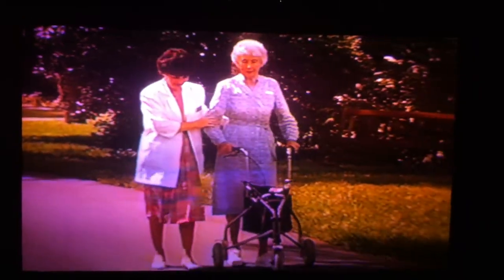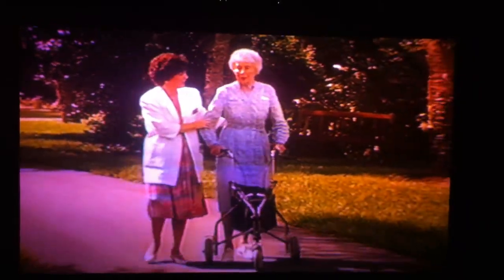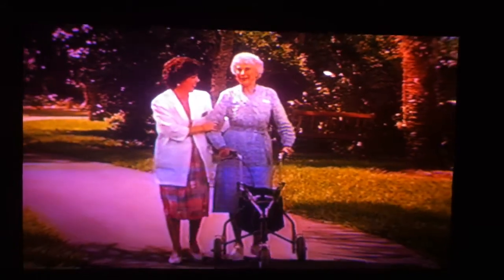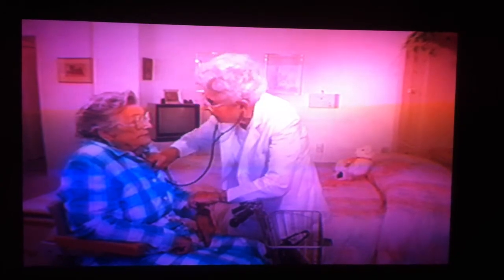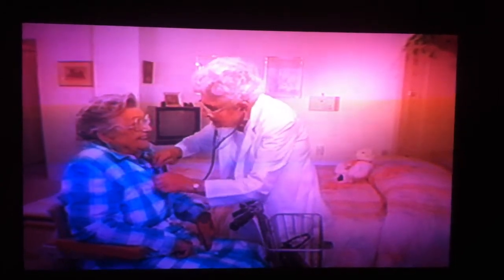Thousands of cardiac pacemakers are inserted into patients every year. Pacemakers can be inserted into the right atria, the right ventricle, or both. The function of a pacemaker is to initiate an impulse when the heart's normal conduction system fails to provide an impulse in a timely manner.